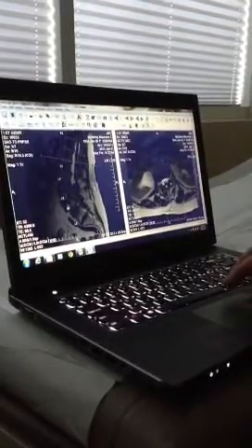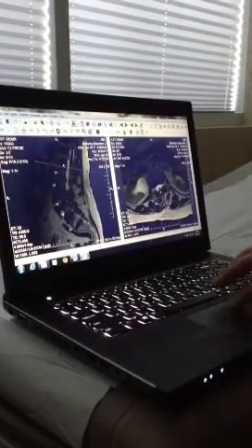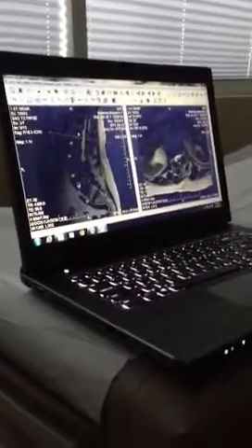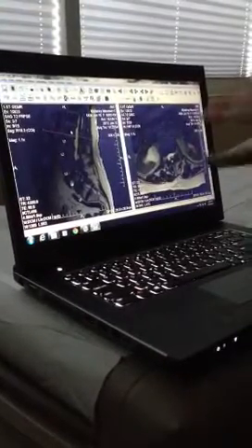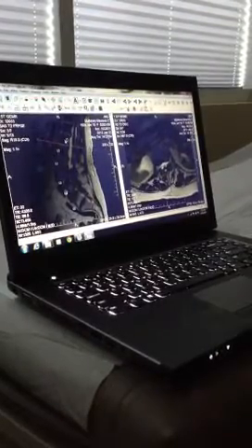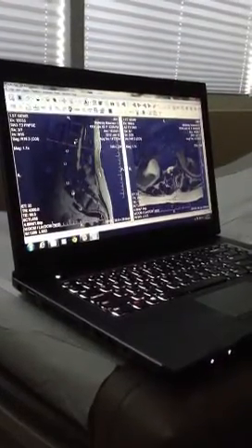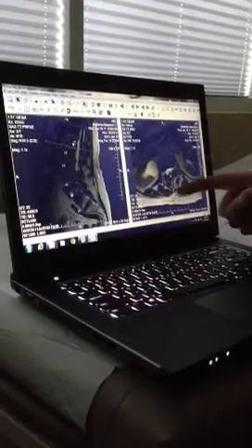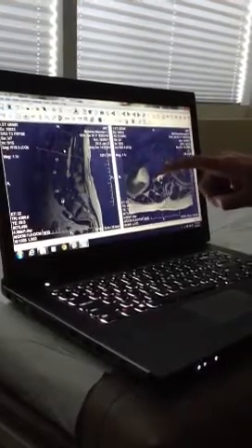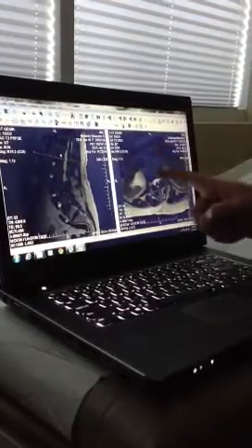Make sense? Okay. So, now, we're going to use this as our control level. Now, the reason we're going to use this as our control level and not a picture of a normal MRI is because everyone's control is different, okay? All I care about is what your control level looks like, all right? Or an area where there's no nerve impingement, so I can show you that. Well, your control shows scoliosis, right? Because we know you have scoliosis. Now you could see the bone, right, pointing, or the disc pointing in this direction, okay, around 11 o'clock, okay, instead of up and down, which would be 12 o'clock.